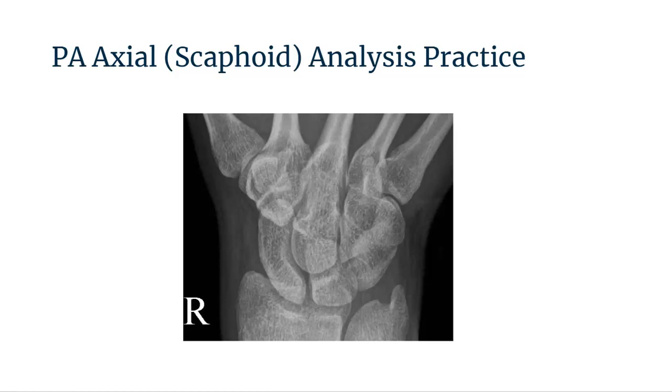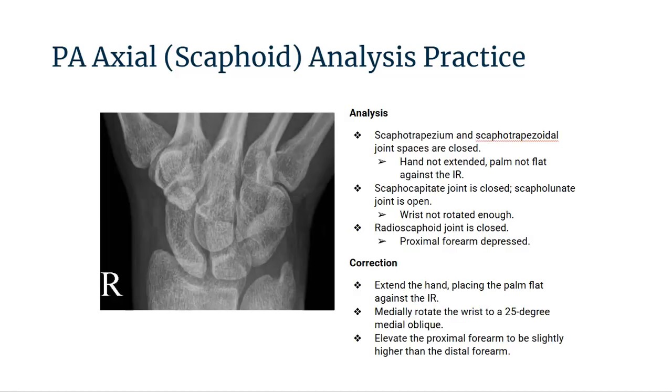Go ahead and analyze this image and answer the following question. So let's dive down into this image analysis. In this projection, again, you want to ensure that you obtain all the anatomy necessary. I will say this is some tight collimation, so we may need to open up proximally and distally, depending on hospital protocol. However, let's look at the anatomy.